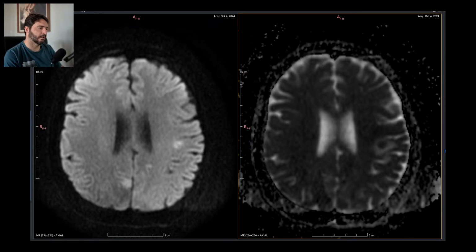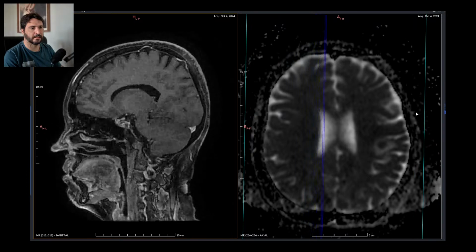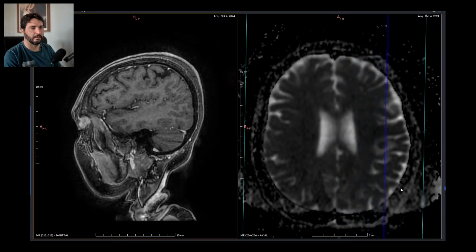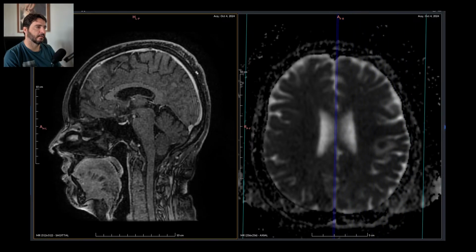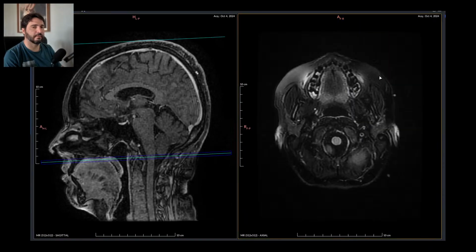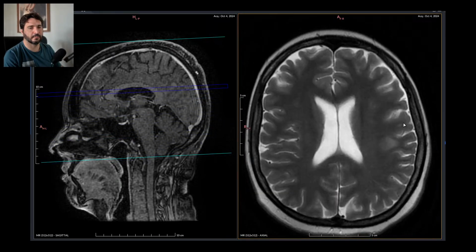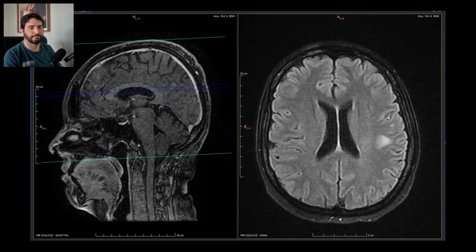So this is starting to look like secondary metastatic disease. I wish I had clinical history, but we don't have any. We're just going for guesswork here. So guess away.